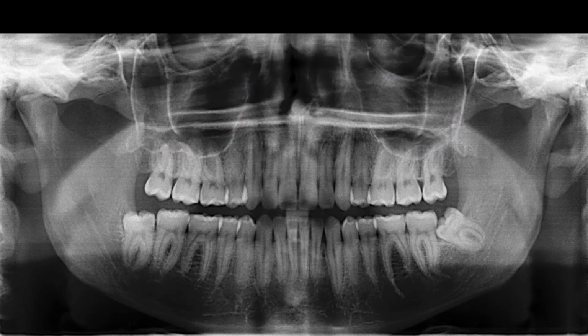So first thing, how I like to read a dental x-ray is I usually start on this pointy part. I'll start on the patient's right-hand side. That pointy part up top here is called the condyle. That's basically the part of the jawbone that is the jaw joint. So I check that, make sure that looks okay. Again, this person, I'm not expecting to see any cracks or breaks in the jaw. They have no complaints.